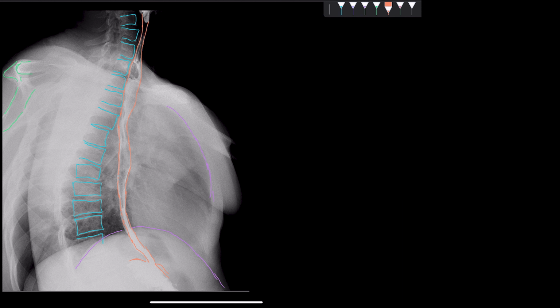Now, in the extent of this esophagus, which is a muscular tube, it is narrow at certain landmarks. These narrowings are because of the presence of certain anatomical structures. The place where it begins, there we have a sphincter, and that is due to the cricopharyngeus muscle.